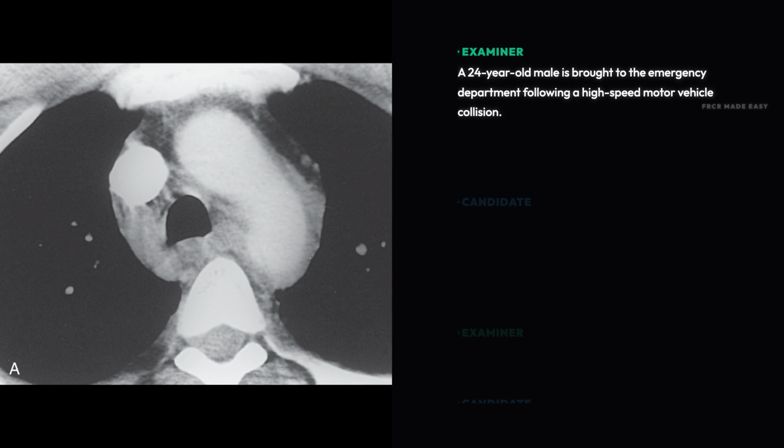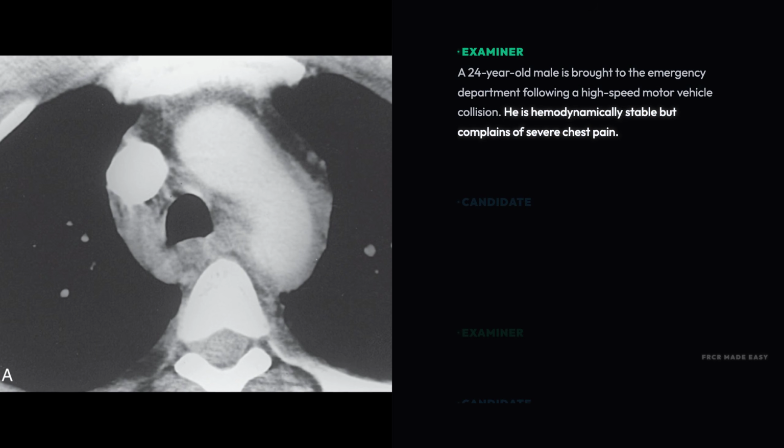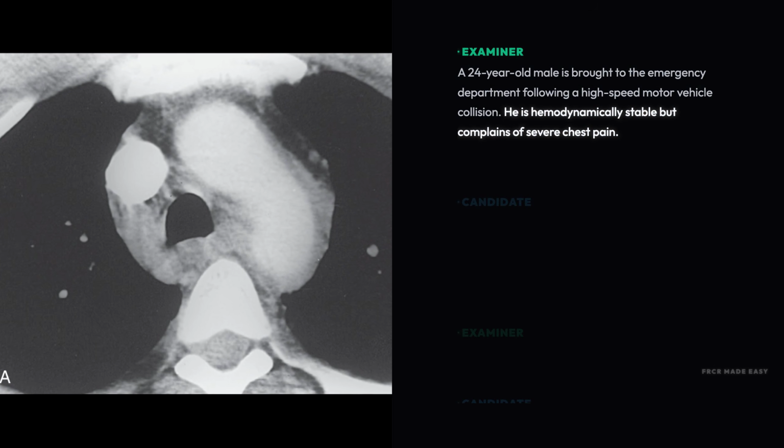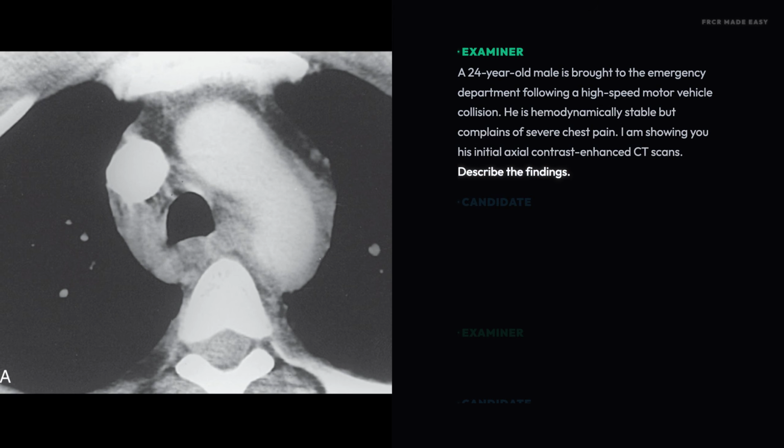A 24-year-old male is brought to the emergency department following a high-speed motor vehicle collision. He is hemodynamically stable, but complains of severe chest pain. I am showing you his initial axial contrast enhanced computed tomography scans.